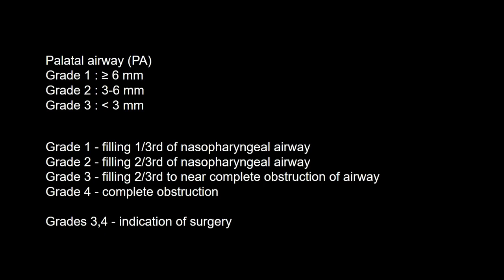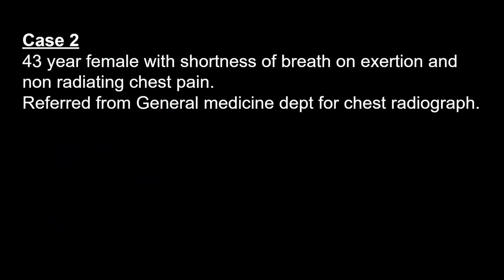Coming to visual grading of adenoid hypertrophy, grade 1 is one-third filling of nasopharyngeal airway, grade 2 is two-third filling, grade 3 is two-third to near complete obstruction, grade 4 is complete obstruction of airway. Grades 3 and 4 are indications for surgery.